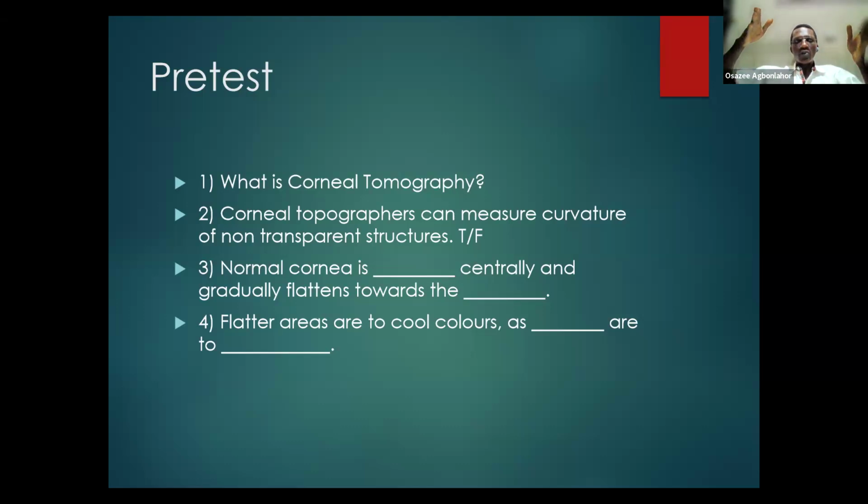It gives you one section of one part of the eye, one tomogram, and goes to another aspect and gives you that. Section by section of the entire retina. So that's what it means by sectioning. Tomography in itself talks about information about the entire area that you're looking at, from anterior to posterior. That's what a tomogram is.